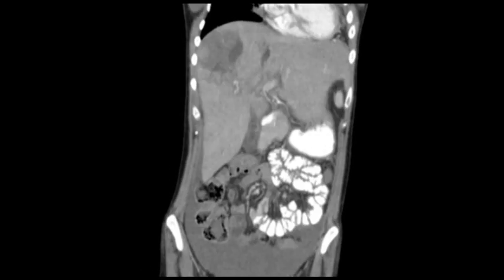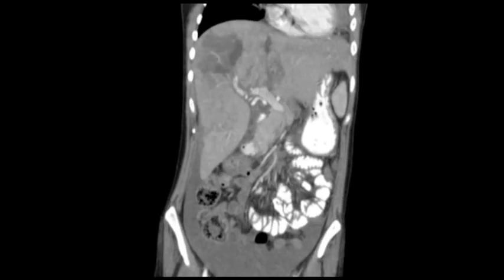What's the most critical finding in this case? It's the liver injury, the liver laceration. And when we see such an injury, what's our next step? Grading of the liver injury, because it will judge further management. Which grade do you think this is? There is an American Association for the Surgery of Trauma scale. It appears to be deep lacerations, so I think it's grade 4. Perfect, exactly. It is a grade 4 liver laceration.